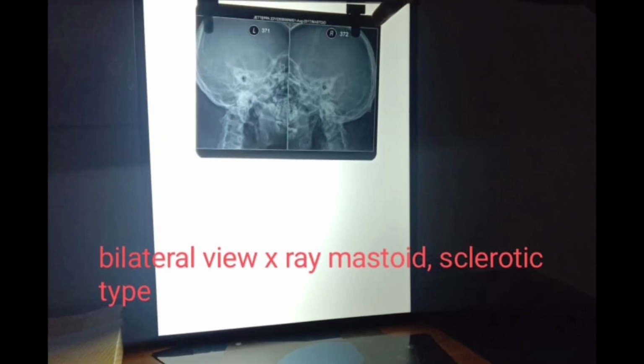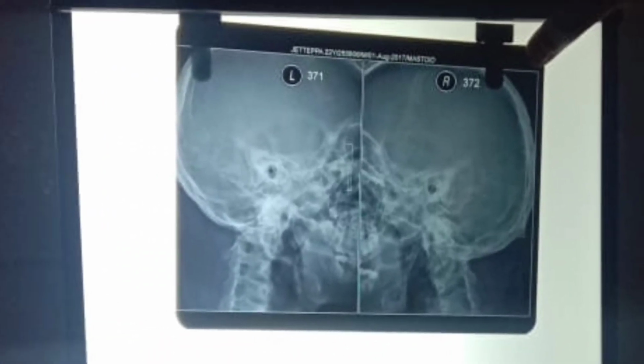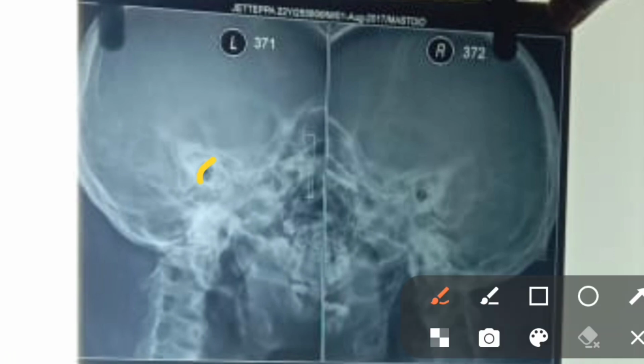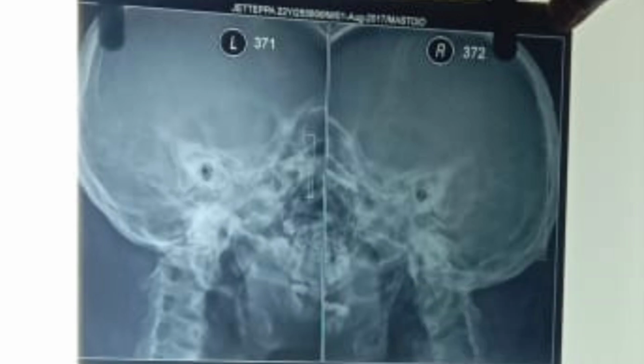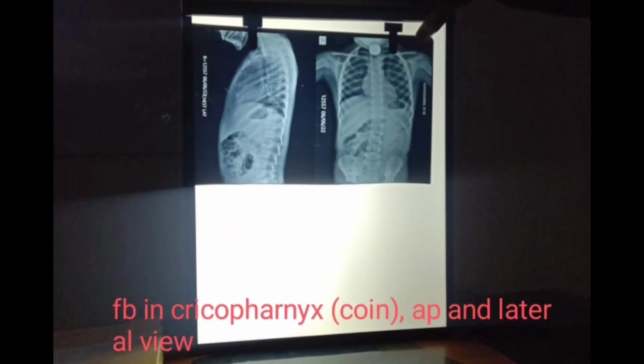Next, this is a bilateral view of the X-ray of the mastoid, sclerotic type. I have already told you what happens in sclerosis. The mastoid air cells are not seen, and the size of the mastoid antrum is reduced. Here is the external acoustic meatus, and behind it there is sclerosis.